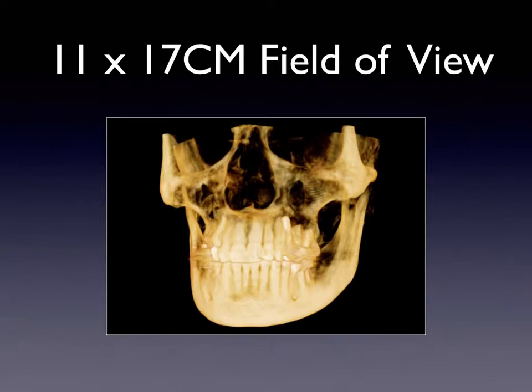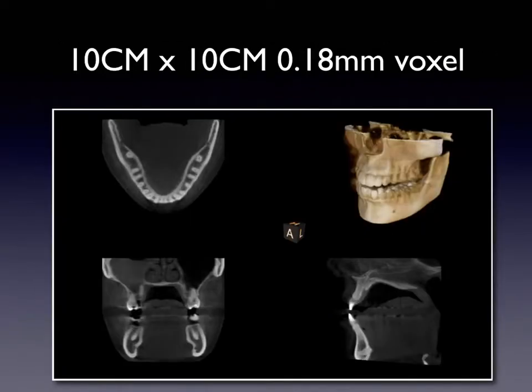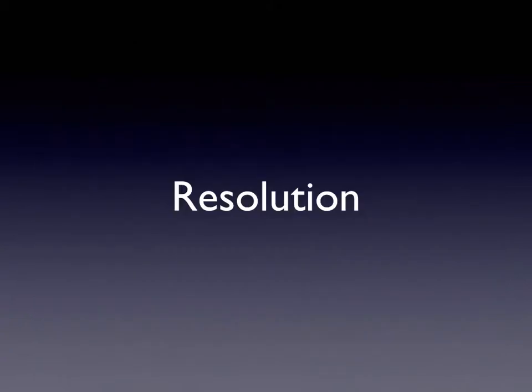done over the years. Our 10 by 10 centimeter view is really good for mixed dentition reviews or just for the smaller individual. The voxel size is less than 0.2 of a millimeter, so the detail is really very good. And this replaces the 2D pano and provides a lot more information. Then we take a 2D ceph, our head film, in order to look at the overall profile of the skeleton. A smaller field of view gives better resolution.